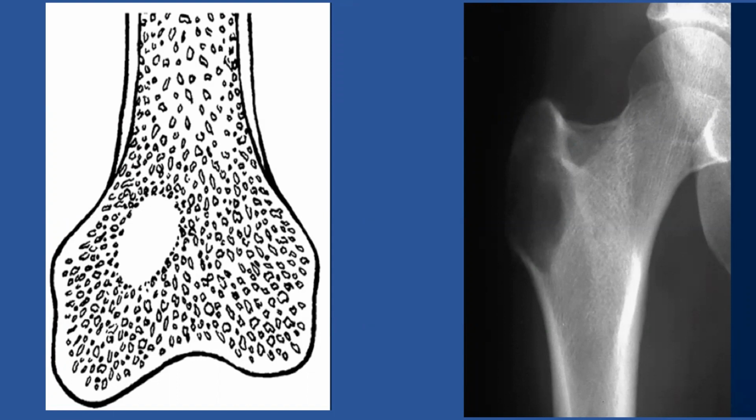It's an active lesion. So always we ask the question on plain X-rays, what is the lesion doing to bone and what is the bone doing to the lesion? Keep this in mind, you young fellows who are sitting for the board exam. Stand on your two feet, and if they show you a lesion like this, the very first thing you say, what is the lesion doing to bone and what is bone doing to the lesion?